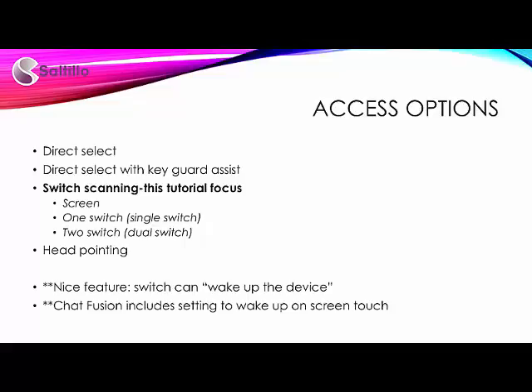The hardware and software on the NovaChat and Chat Fusion will allow for single or dual switch scanning, as well as setting the screen to be used as a switch. A nice feature with scanning is the ability to wake up the device with the switch activation. Chat Fusion also offers the ability to wake up on a screen touch within the settings. First, I will be describing the switch methods, then offer a demo, and finally walk through the setup. I will be using NovaChat devices and Chat Fusion for the demonstrations.